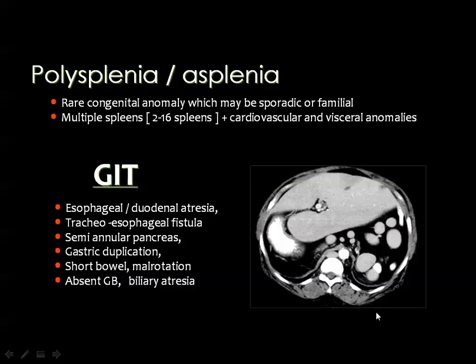In this condition, there are two other major almost fixed abnormalities in the patient. Number one, the abnormal position of the liver, which may be in the middle of the abdomen, what we call situs ambiguus, and number two, the absence of the inferior vena cava, which is continued by the hemiazygos vein. Here also you can see that the stomach is on the right side of the patient.